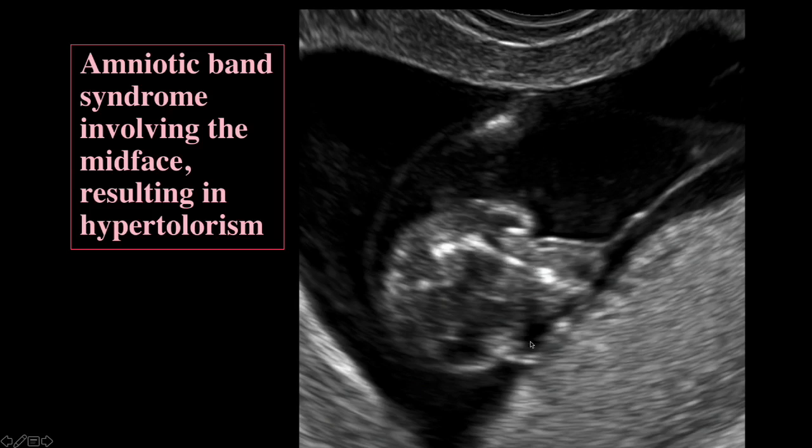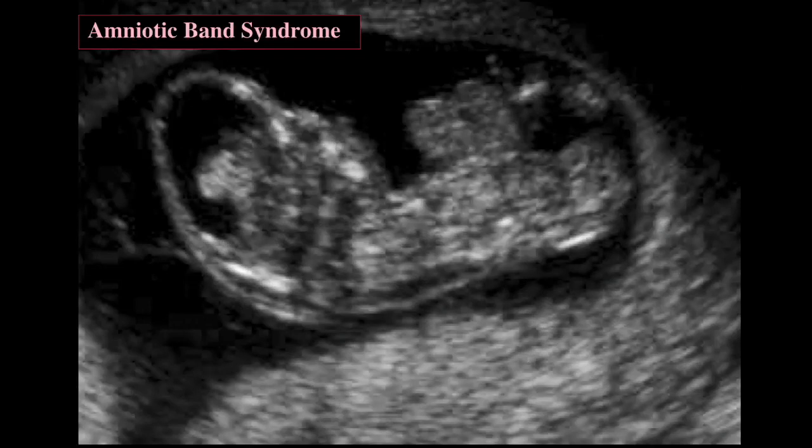Here's one orbit, the other orbit somewhere over here, so that did cause hypertelorism, among other things, obviously, in this particular case. Here's a view of a patient with amniotic bands that disrupted everything here. Disrupted the anterior abdominal wall, the cranium, and the face.